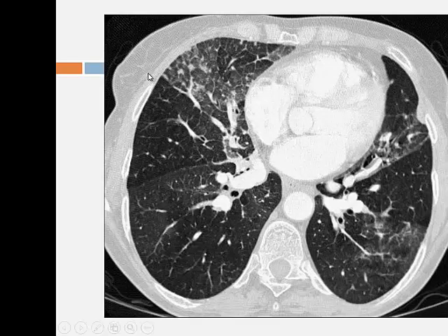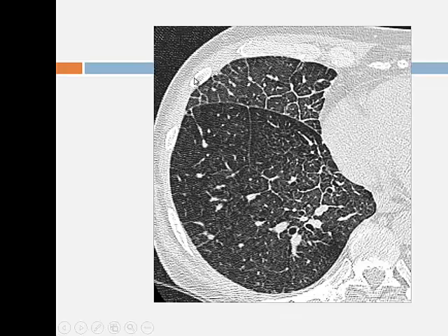Again, interlobular septal thickening. Sometimes you can even see nodules. It can be quite tricky. But this is what we mean by interlobular septal thickening for the cardiologist. So it looks like street paving. And sometimes when it's associated with ground glass, we think of crazy paving, but that tends to open up a big differential for radiologists. When we say crazy paving, we mean pulmonary alveolar proteinosis, which is another condition.